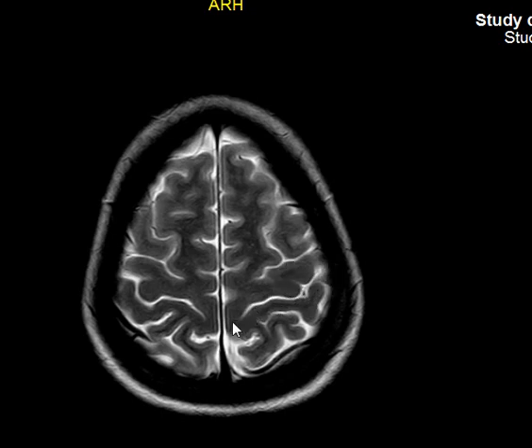Now, the gyrus anterior to the central sulcus, this is the central, okay? I think it's obvious here. So, the gyrus anterior to it is the pre-central gyrus, while posterior to it is the post-central gyrus. Pre-central gyrus contains what cortex? Motor cortex. Post-central contains sensory cortex.